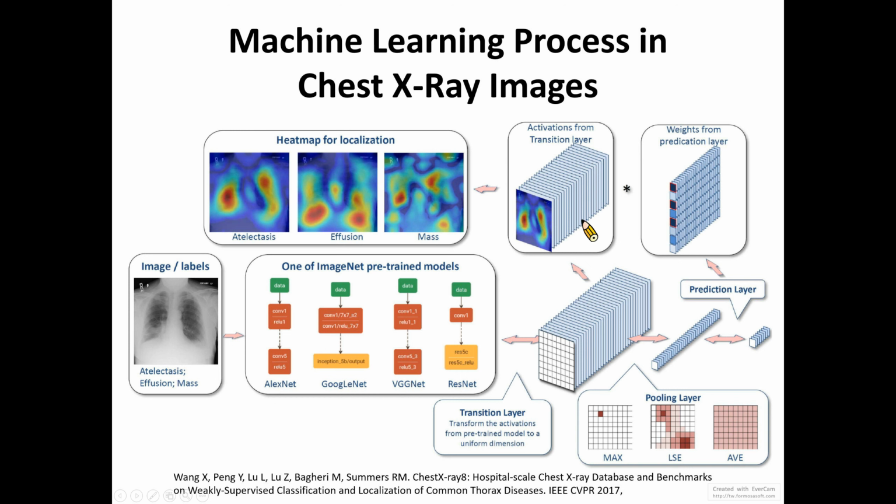For example, if you click on the data layer, which is the image input layer, it shows the activations are 227 by 227 by 3. This means that the input images have a dimension of 227 by 227 pixels, but because they are color images, there are 3 channels, including blue, green, and red.